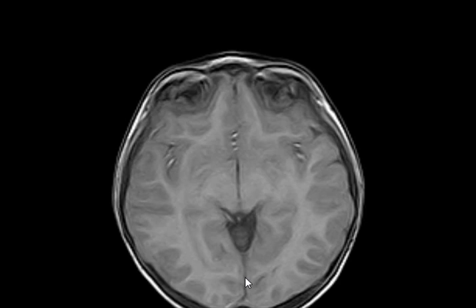Brain looks normal, intracranial compartment looks normal, optic nerves look intact, other globe looks normal. Yes. No signs of extension outside the globe, no signs of invasion to other structures. These are all very important negatives. مو بس positive, we have some important negatives regarding this particular case. Okay. What?